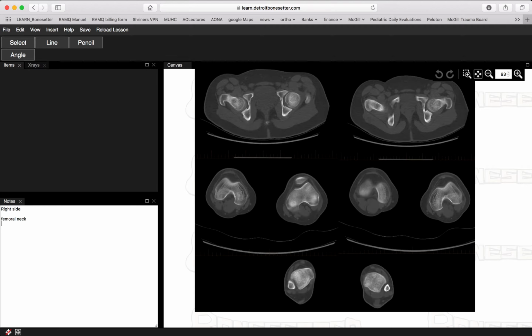We're going to do femoral neck, distal femur, and ankle. And then again, keep in mind net femoral version and net tibial torsion. That's basically what we're getting paid for, is to figure out what the answers for that is.